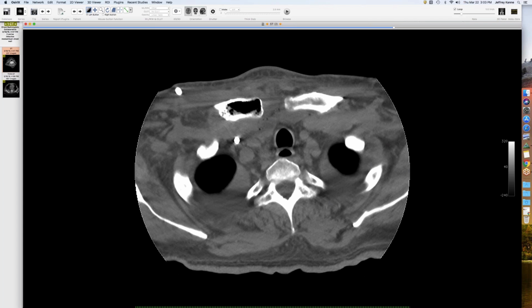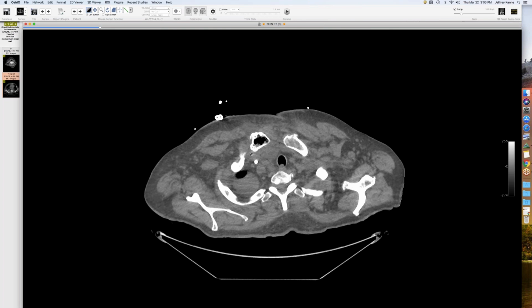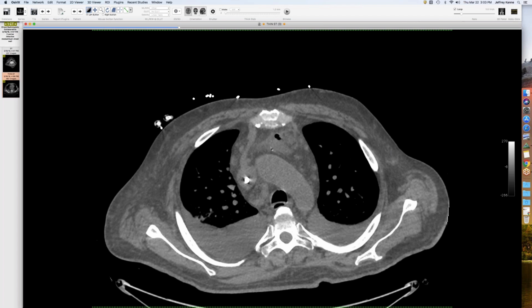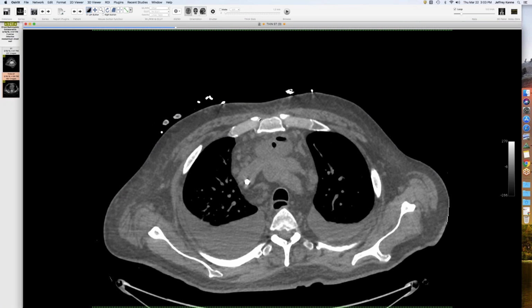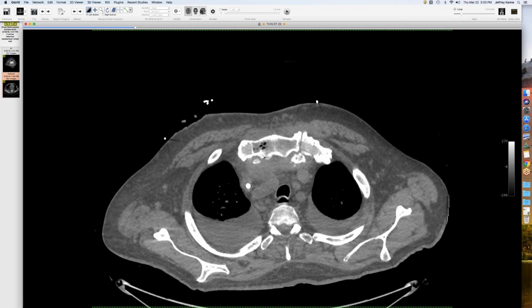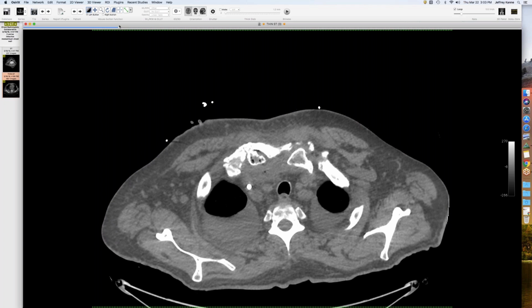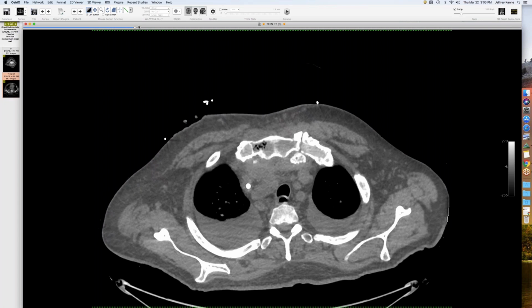And I'll switch over to the chest CT, which just shows the rest of it. It's quite impressive because there's gas inside the bone marrow space of the clavicle and the manubrium, so it's going through the joint, and then there's an abscess in the prevascular mediastinum, and all this chest wall edema and inflammation. They had to go in and debride a bunch of this stuff. They resected the bone. So this is an abscess that then caused direct spread and osteomyelitis, and they had to drain it. But it's all related to sepsis, presumably from the foot ulcer that then seeded everything else. I don't think I've seen this much gas in a bone before, so it was quite impressive.